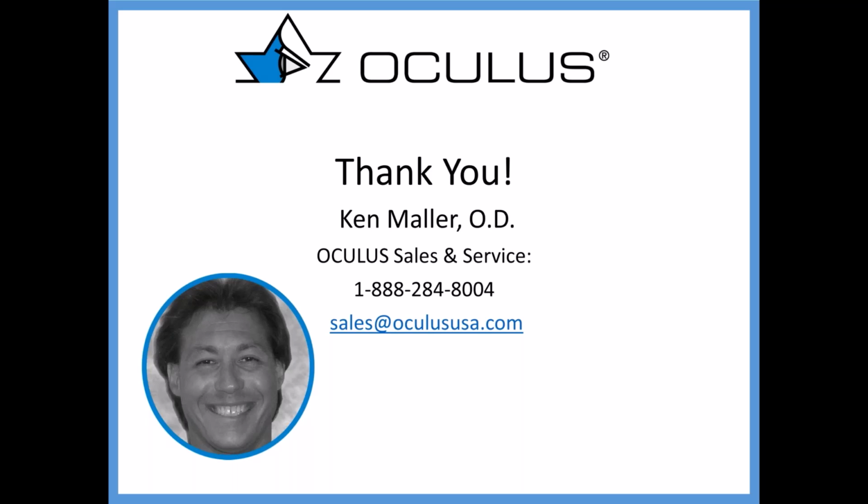Well, that's one of the nice things on Wave. Wave gives you the ability to decenter the multifocal optics. So if in fact you have a scleral that is decentering temporal and down, which is typically where they will decenter, you can go ahead and move the multifocal zone so that it's better centered onto the visual axis, so it doesn't disturb the distance nearly as much as you would expect. I honestly, though, work considerably harder to get the lens actually centered, so I don't have to decenter the optics, because it just complicates things even further.